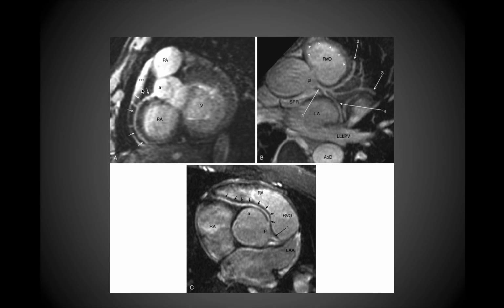And then over here, this is again a small pericardial effusion that you're able to appreciate and labeled by those 3 stars. If you move over to the image on the right, image B, once again we can see the aorta and the right ventricular outflow tract right here, the left atrium, and then the left lower lobe pulmonary vein that's coming in and dumping into the left atrium. You can see one coming from the right over here as well. This is just a pericardial recess right here. The superior pericardial recess is what's being pointed out right there, so you can kind of ignore that.